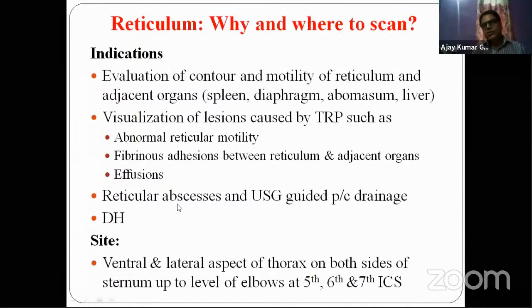Why some of the reticular abscesses? Because only those abscesses which are very close to the abdominal wall and are in fixed position can be lanced or drained percutaneously under ultrasound guidance.